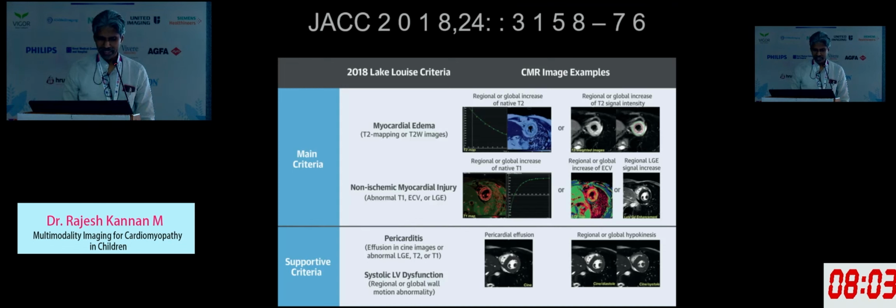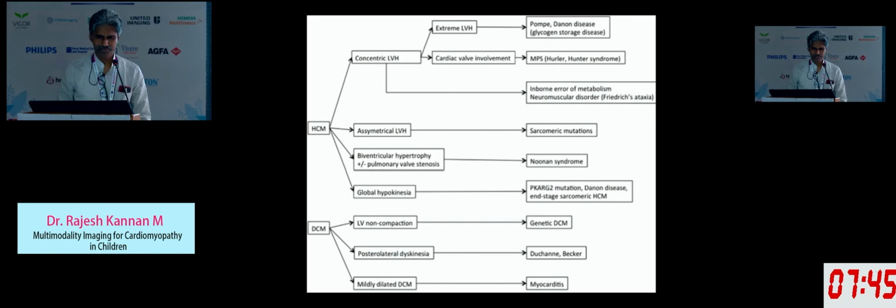So we all know the 2018 modified Lake Louise criteria. So as per the criteria, just by looking at the T1 and the T2 map associated with the other findings with the appropriate clinical condition, we can make a diagnosis of myocarditis.